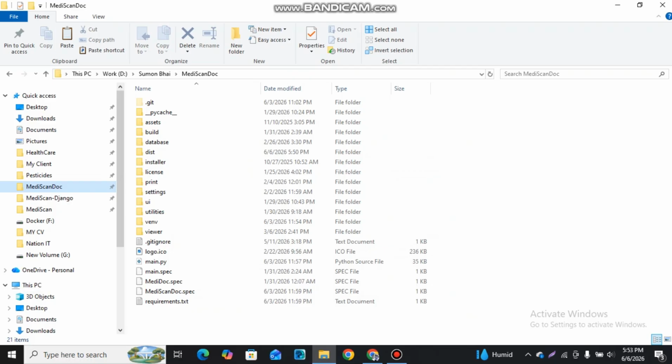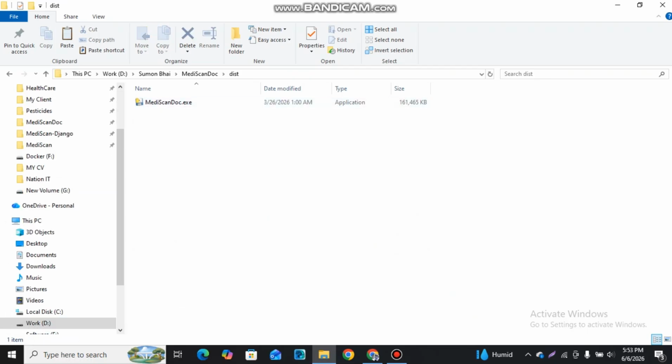Now I will discuss this project. It's our project code and it's our project exe file. Now I will run it. Double click it. Then first time I will install this project.